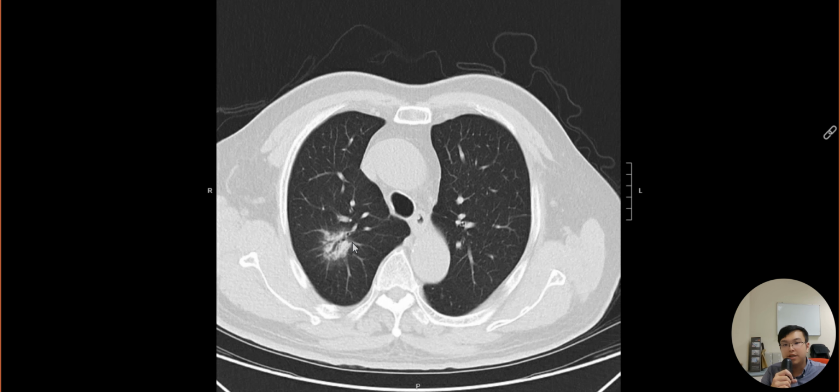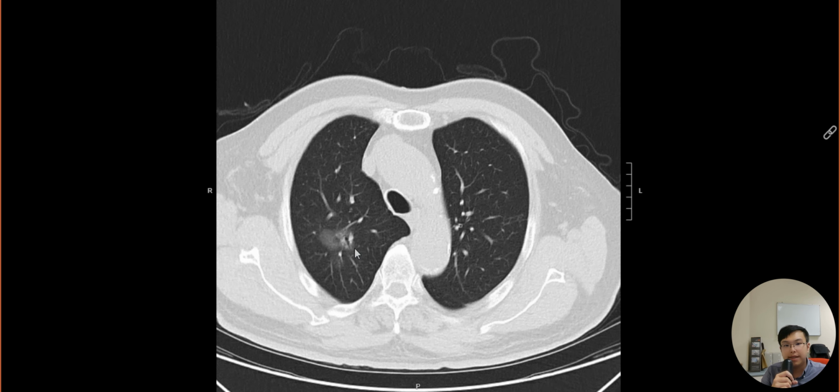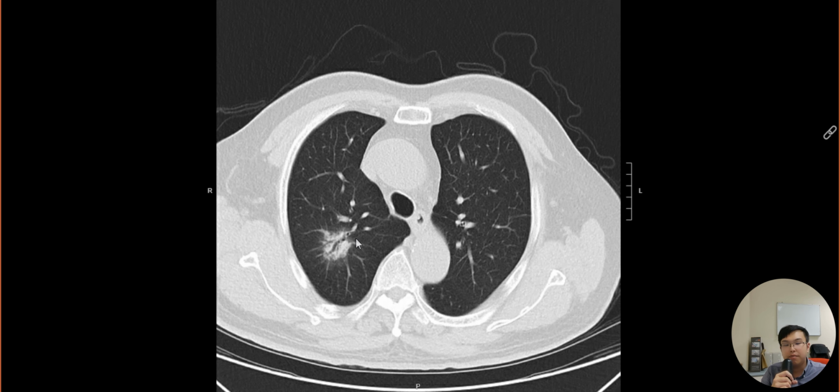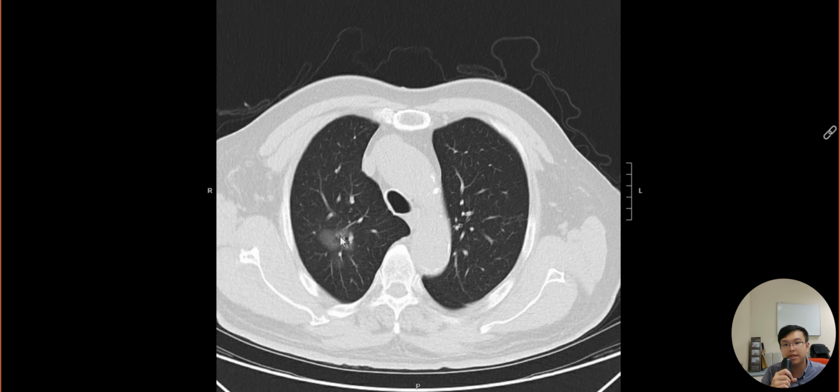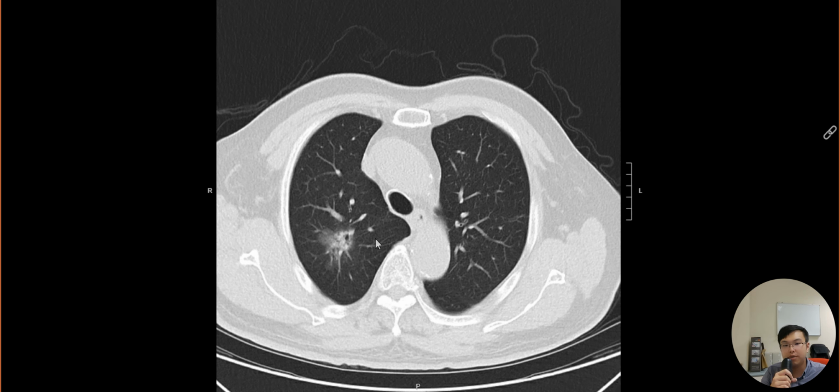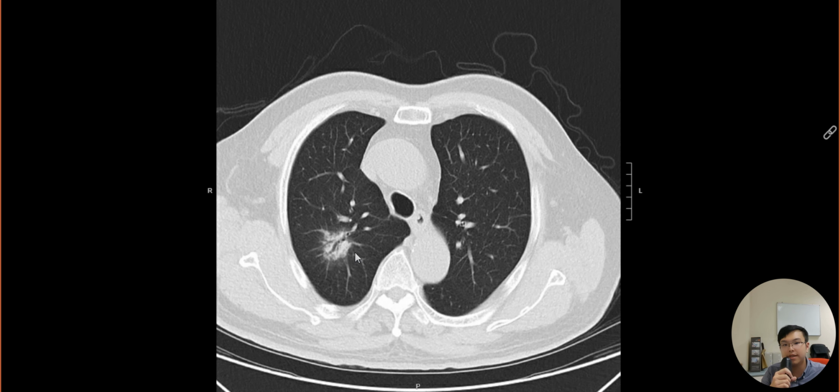And actually it is quite suspicious of underlying malignancy, which is even more likely than a pure solid or pure ground glass component. It is also very classical for adenocarcinoma of the lung to have this kind of appearance. If we have some previous CT, initially we may see that most of these lesions start from just a ground glass nodule, and then after several follow-up CTs, we will start to appreciate some sort of solid component which will gradually increase in size.